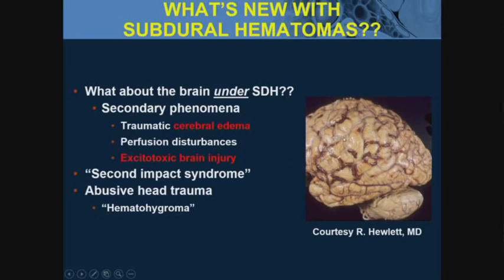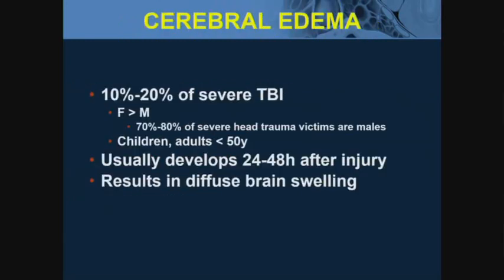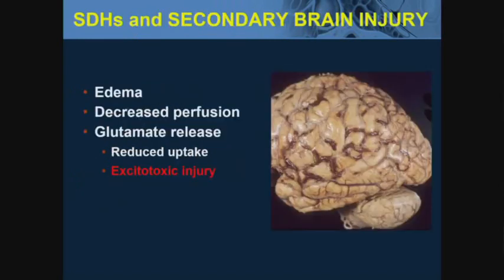What did this patient in was not the size of the subdural hematoma, it was the out of proportionate brain swelling that occurred. Is this because these patients actually have had a prior brain injury, and this is a form of second impact syndrome, which we'll talk about in a moment? Nobody really knows. But let me alert you to an imaging finding. So let's just look at our usual cases of cerebral edema, and then we'll look at what happens under small, thin subdural hematomas.